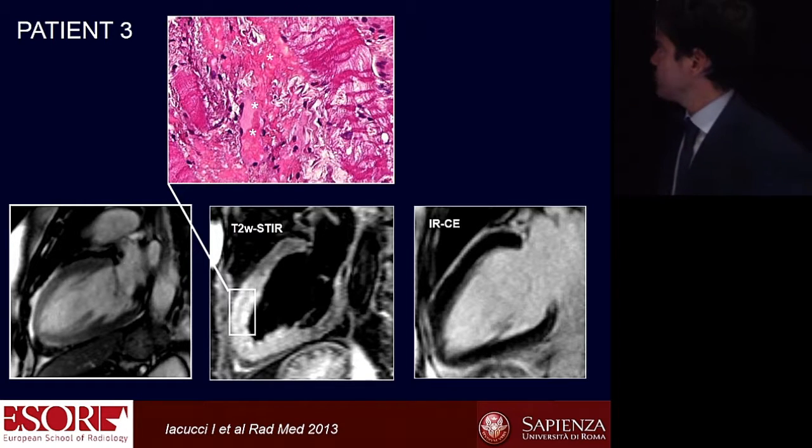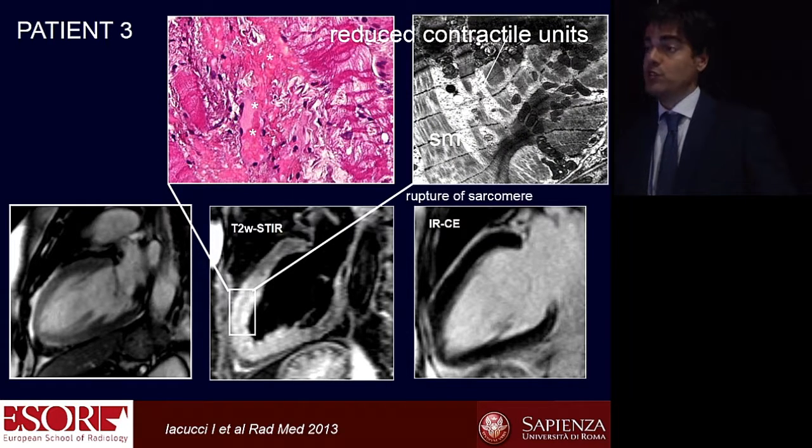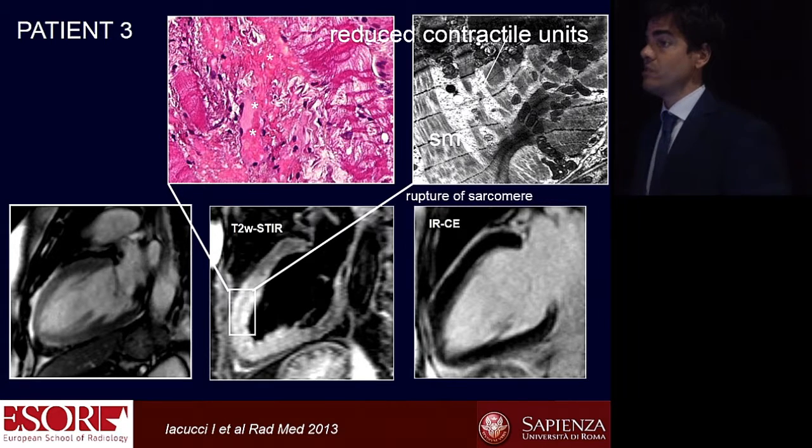And this is a matching of electron microscopy with conventional staining. What this shows here is that there is a stretching with an injury of the myocardial fiber. This is a Takotsubo. What happens in Takotsubo is exactly comparable to a muscular injury. It's like having an injury of the leg or the arm, of the biceps or whatever. So this stretching is related to the catecholamine production, which causes rupture of the fibers and edema without late enhancement.